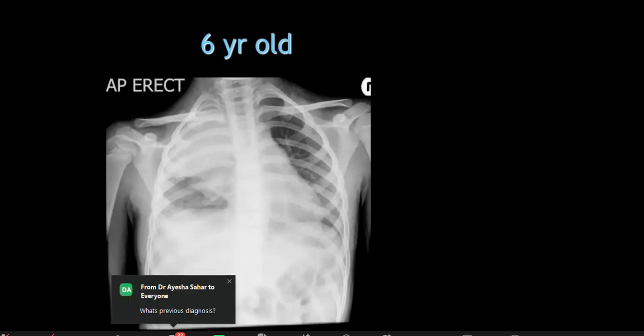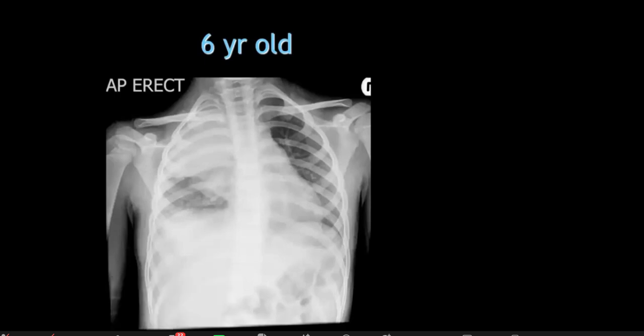There's maybe some atelectasis in the right lower zone, but the main finding is in the right upper and middle zone with the air fluid level signifying there is an air-filled cavity. If the patient is unwell, this could represent a lung abscess. I'll need to correlate clinically with the team.